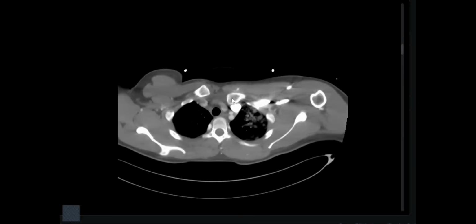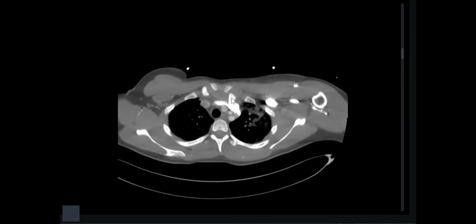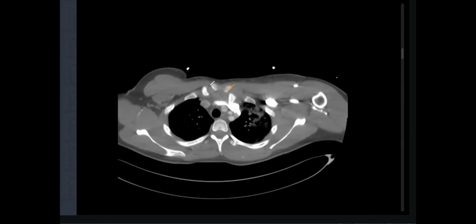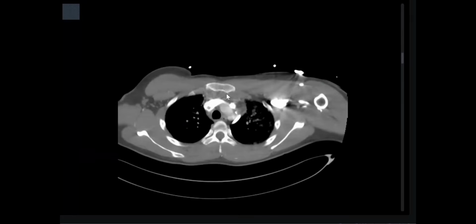What is this structure? That bone is coming. Yes, the clavicle. Why is the clavicle present here? The clavicle is impinging on the left brachiocephalic vein. Both sides are asymmetric. Exactly, so it's a sternoclavicular dislocation and impinging. Very good. So this is a hidden case and, unfortunately, commonly missed, my friends, and it's one of the dangerous signs here.